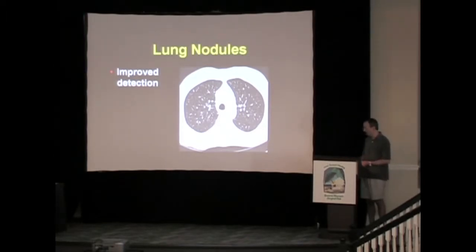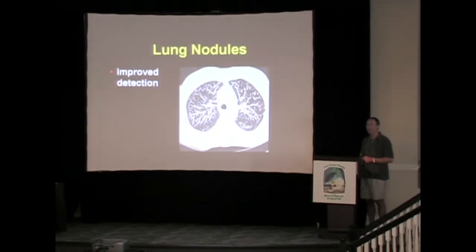But on this axial image, you'll probably look around and see a couple things that look like a nodule. But if we take that same data set and turn it into a maximal intensity projection, we see how many other nodules become visible. So these techniques can also help the radiologist to determine the overall number of nodules.